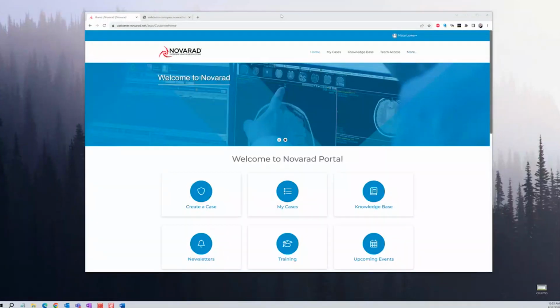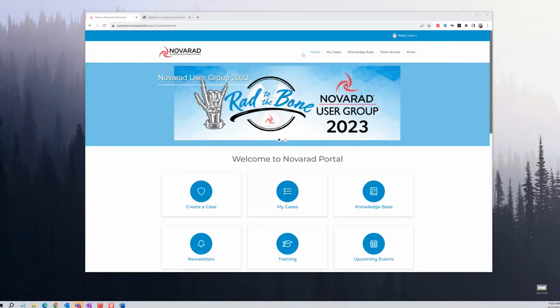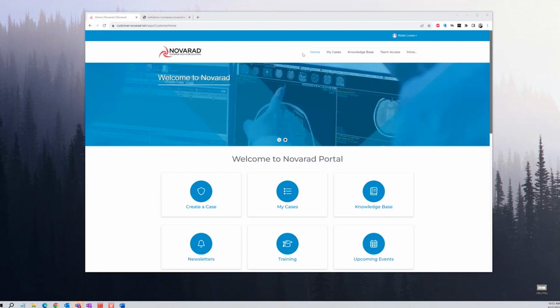All right, customer portal. Why do we want to show you the customer portal during the advanced PACS admin training? Because it's a super powerful tool for any PACS admin, any department leader. There's a little bit of information that I should give you right off the bat. If you're not familiar with the Novarad customer portal and you would like to use it, it's free for all of our customers. Send us an email at portalrequest@novarad.net. And then just include some basic information like your name, the facility you work at, what your title is, and your phone number, and we'll get you access, no problem.